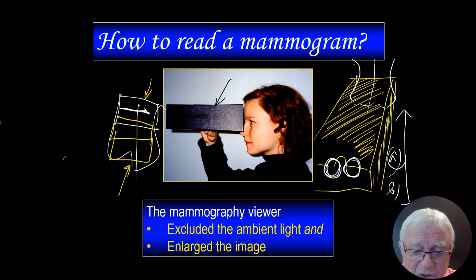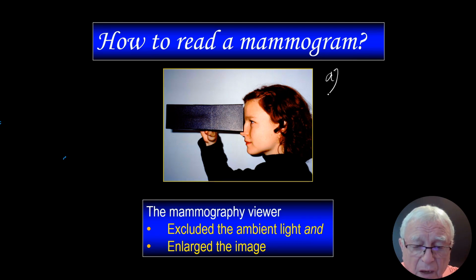This is my message for you today. This is going to be one of the most important things you're going to learn. You should never view a mammogram without enlargement and without making the mammogram darker.